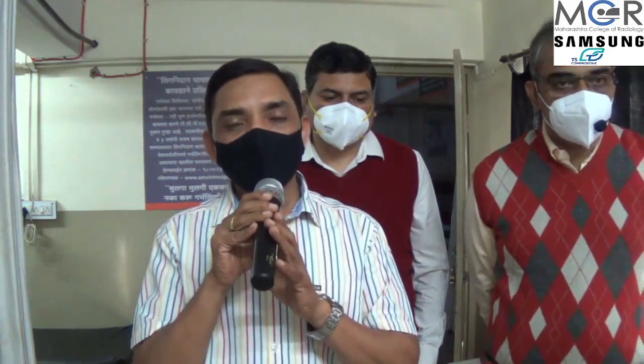In today's workshop, especially in vascular malformations, we will try to see the different patterns of vascular malformations and their appearance on Doppler ultrasound. In abdominal ultrasound, we will try to evaluate the less-seen areas, that is the omentum, bowel, adrenals, internal hernias, external hernias, indirect hernias, direct hernias, and how to identify and interpret them. In addition, we will also try to evaluate how to track the undescended testes.